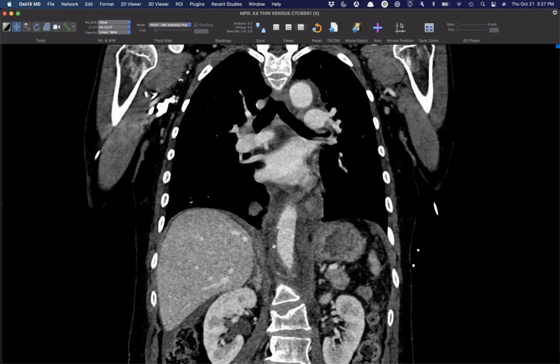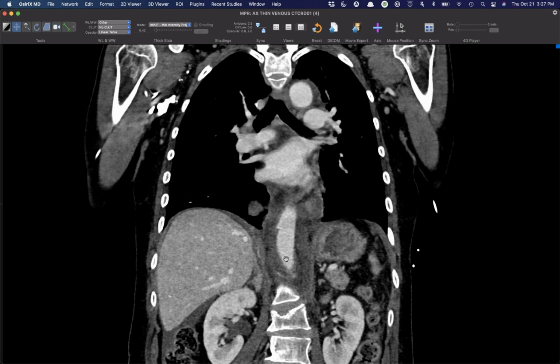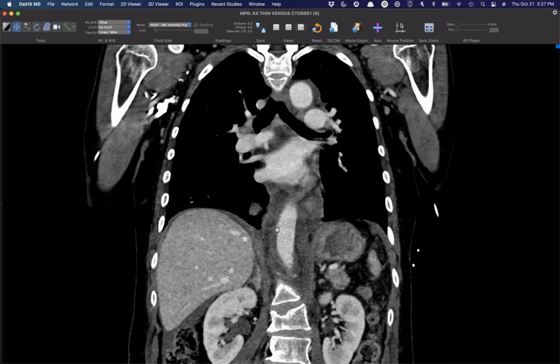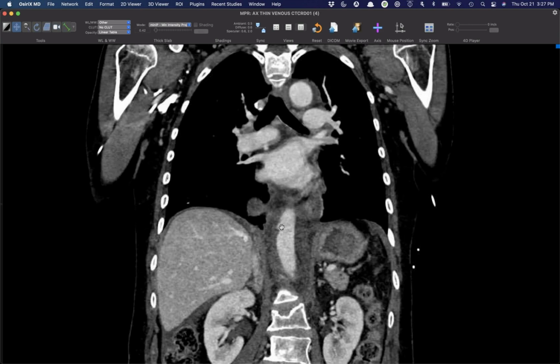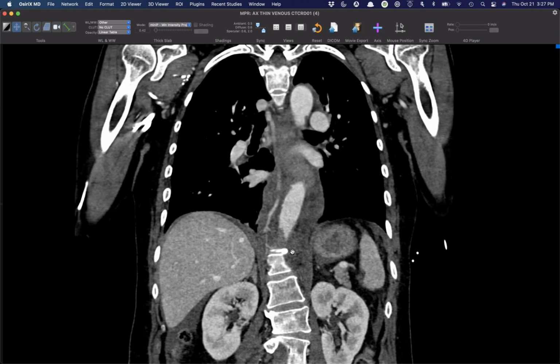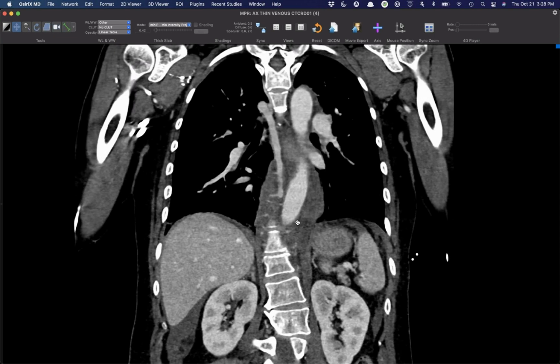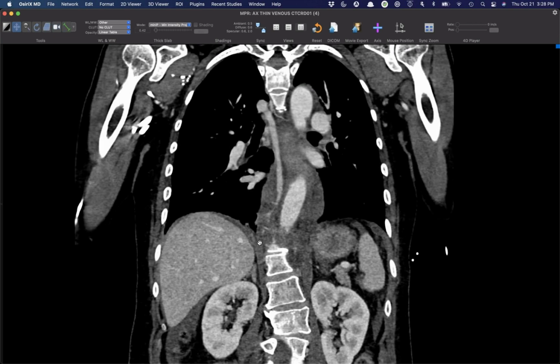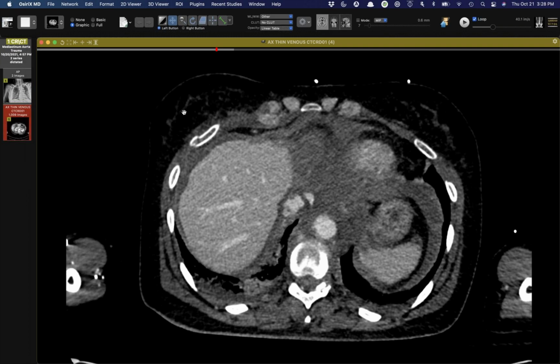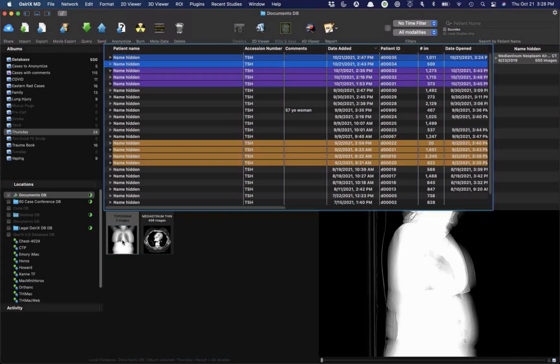Yeah. And here, sorry, this actually looks like it's still mild on the traumatic aortic injury scale, but this one, it looks like there is a little defect in the external contour of the aorta, as opposed to that one up higher. Right. And I don't know about this right here. I was wondering if that's just a little intercostal artery, but this patient will certainly get followed. I'll show you if the case comes up when I show cases, but it looks similar. Okay, great. If it's not fatal.